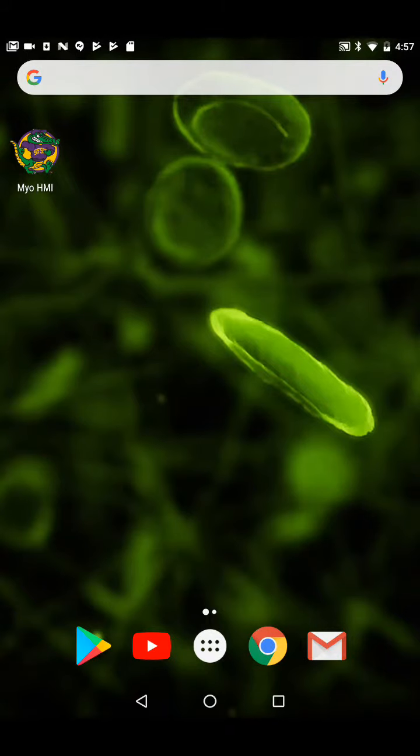Hello, this video covers the features in the Myo HMI Android application created by IceLab at San Francisco State University. You will need a Myo armband in order to use this application. So once it's installed, open it up.